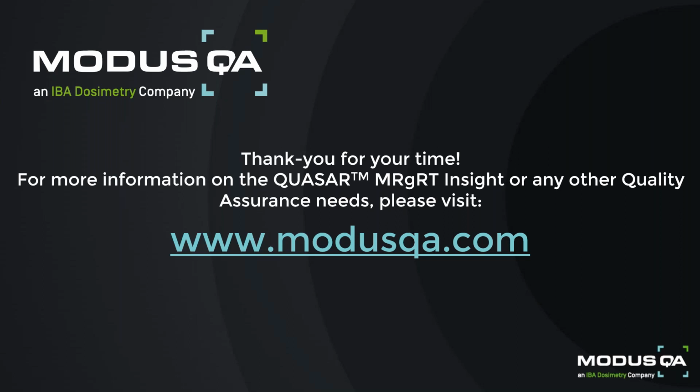So that makes it equally useful for commissioning and periodic system checks, as well as if you wanted to do any optimizing of your scan sequences or biomarker MR imaging such as DWI or DTI, as we know they can both be greatly affected by the GNL. In addition, there are a couple of minor additional tests you can perform with the MRID 3D.